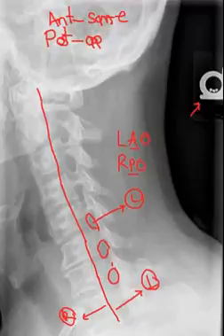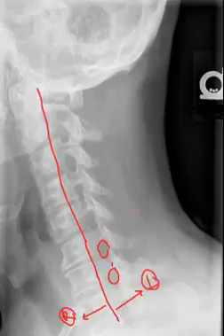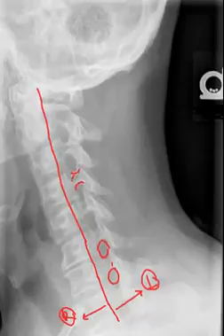But the most important thing clinically is just to realize which side the IVFs are being visualized. I'm just going to clean up our screen a little bit here. Okay, so these are the IVFs. Now I want to draw your attention to the margins of the IVFs. Notice that the roof of any particular IVF is this little linear structure here.